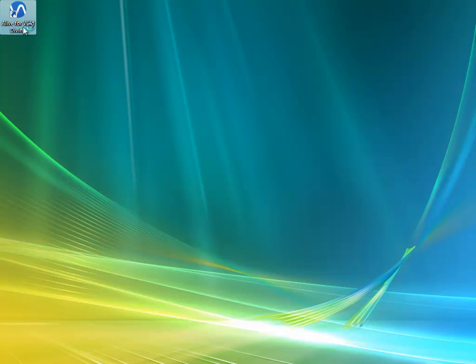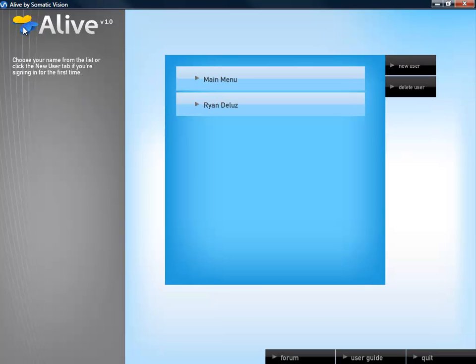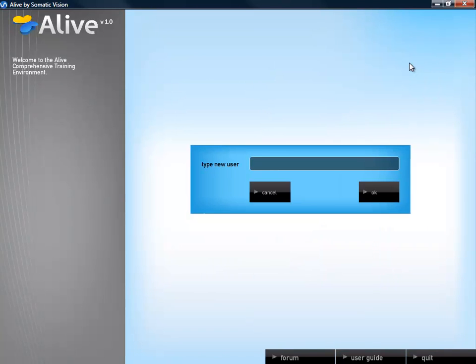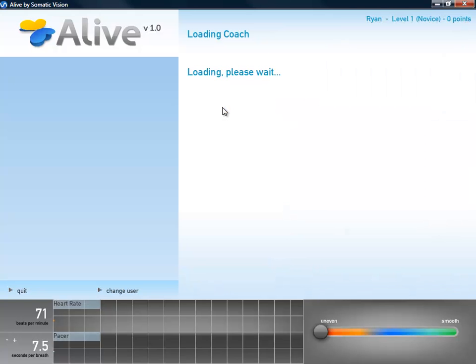So I'm going to open Alive, and one of the first important things that you'll find when you're using the clinical version of Alive is that you can choose to skip past the initial coach introduction. So let's say I create a new user, Ryan, and then I choose that user.